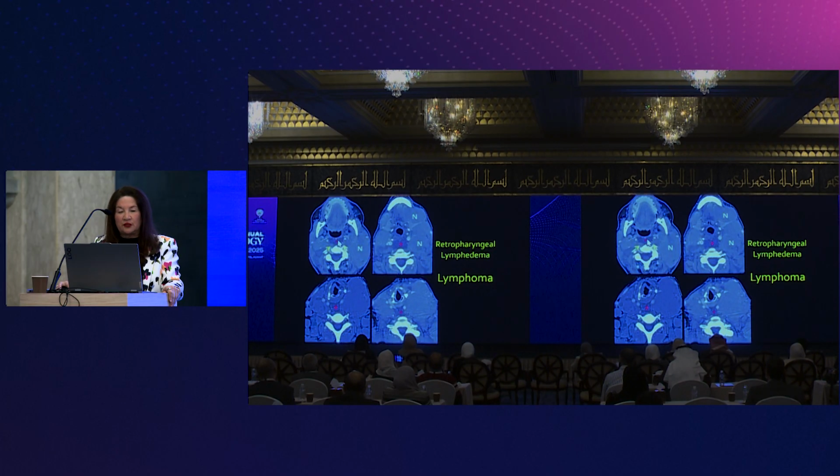That's these structures here. If you look, there is massive lymphadenopathy in this patient that has B-cell lymphoma, and this is just a lymphatic effusion. And if you look more closely, you'll see pockets of lymphatic effusion in multiple compartments in the neck. They had originally called me to biopsy an abscess. I said, the fever's from the patient's lymphoma. I'm not putting a needle in anywhere. This is just a lymphatic effusion.